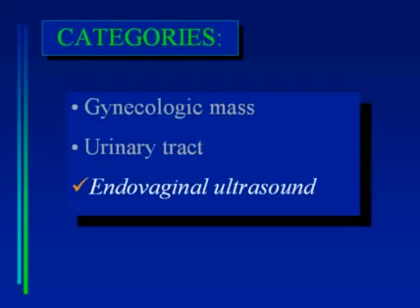We will finish by talking about pitfalls that are specific to endovaginal ultrasound. Now, clearly, if you could only do one ultrasound approach, one would want to do endovaginal ultrasound. The detail it provides allows us to be so much more confident and so much more specific with our diagnoses. But unfortunately, endovaginal ultrasound is not without its limitations.